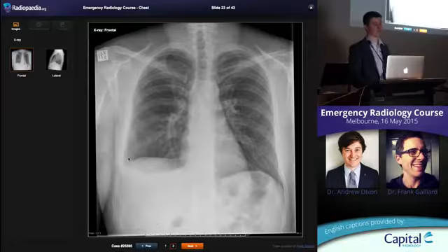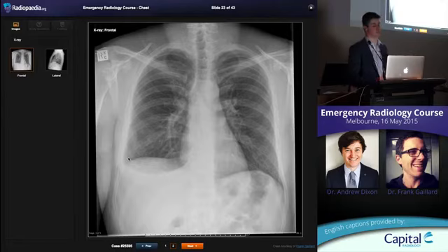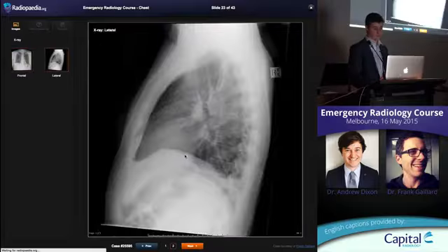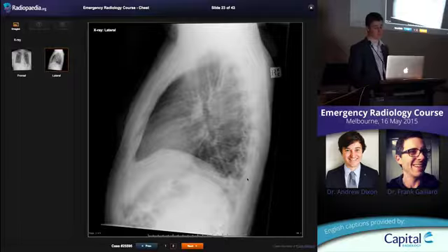It's important for recognising the difference between a meniscus like that, which means it's just pleural space with fluid in it, and a hydropneumothorax, which is an air fluid level, which is going to be a perfectly straight line. We'll see that in a minute. On the lateral image, you can see that meniscus at the back. The lateral image is more sensitive for smaller volumes of pleural fluid than the PA projection, okay? So meniscus at the back, exactly the same as at the front.